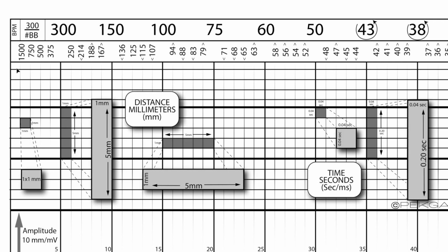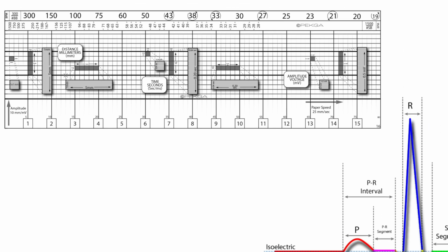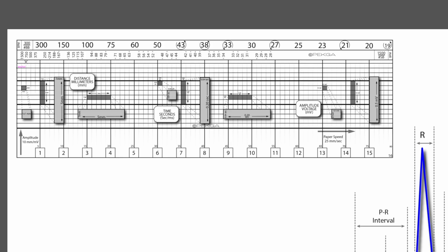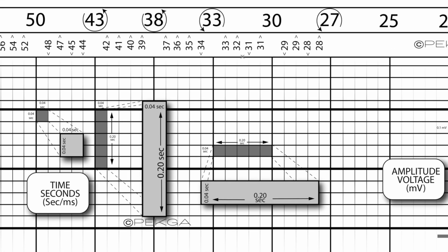Whoops, I didn't mean to zoom out that much. You can count these out, right? 1, 2, 3, 4, 5, or 5, 10, or down here, these numbers, right? 5, 10, 15. I'm looking for 47 and a half. So right here, 45, 46, 47 and a half. This is where my R to R rate was. And up here it says 32 for the 47.